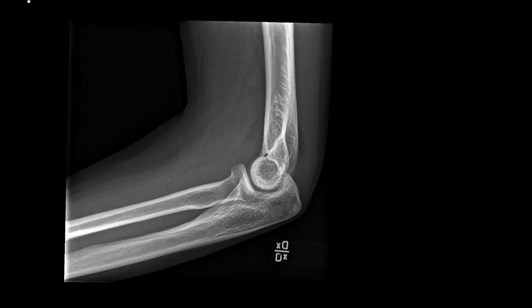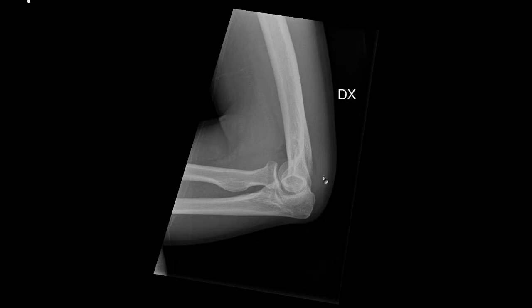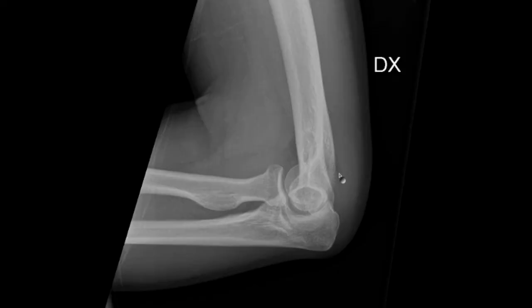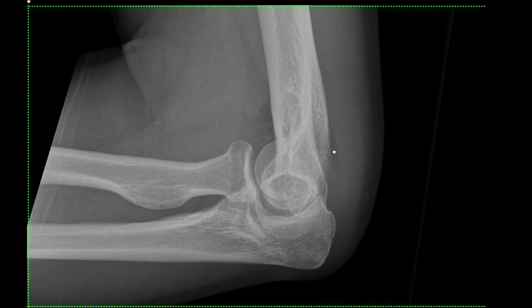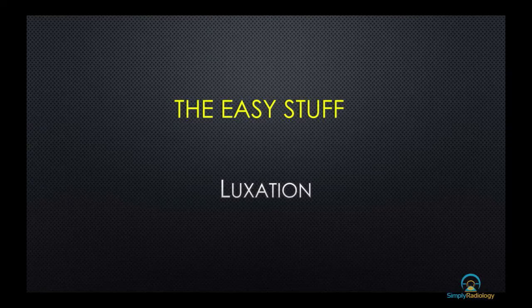All right, so I want to show you one more effusion, and then we're going to go to some more interesting stuff. So here is one more image. It's not very obvious, but you can still see that there is some difference in the contrast here. It's a darker area here, and so is here. And that's how it basically looks in real life, because patients, when they are fractured, don't have the energy to give you a perfect picture, so you have to accept some poorer quality images. So now we have seen elbow effusions, and now let's move on to something interesting.